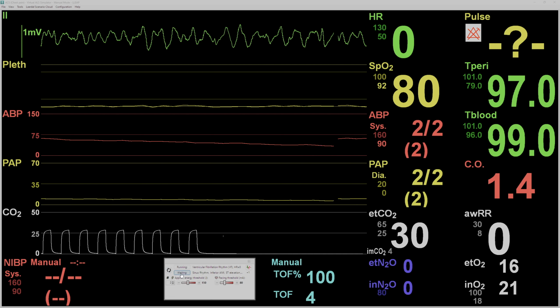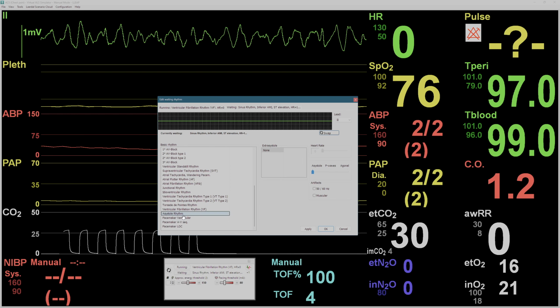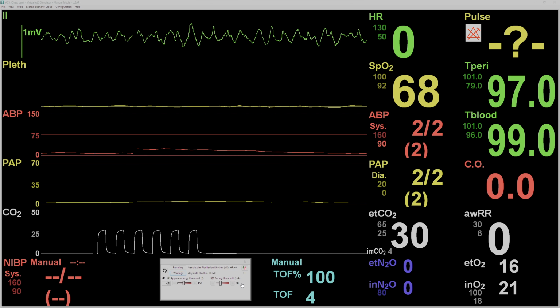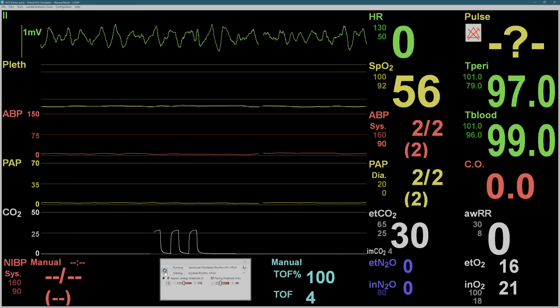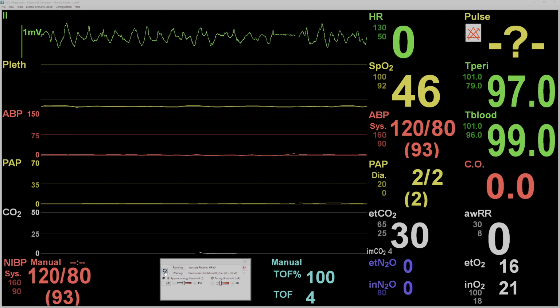And then I'll go to waiting again. And I'll change it to, say, asystole. Apply, okay. After they're done talking about what they're going to do in their first 2 minutes, I go ahead and switch the rhythm again. So I say, all right, so your 15 seconds is approaching. What are you going to do? They pre-charge the monitor, find pulses with compressions, yada yada yada, and then the rhythm pulse check. Switch it out. What do you do?